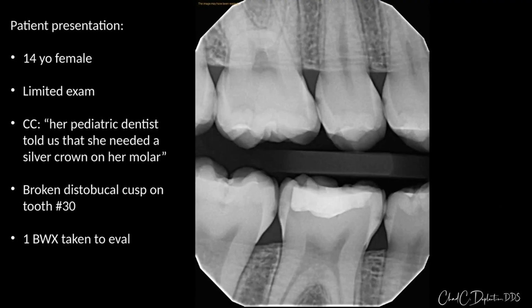This is a young lady. She was 14 years old. This is actually the very first patient that we utilized AI in front of the patient on. So this was our first or second day of having it. She came in from the pediatric dentist. We didn't have any radiographs from the pediatric dentist.